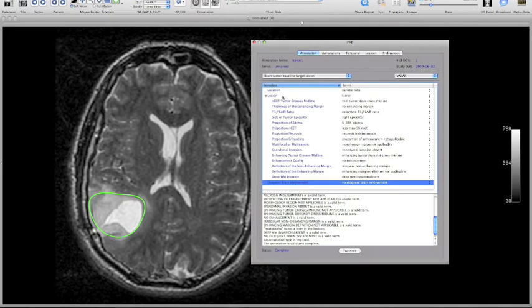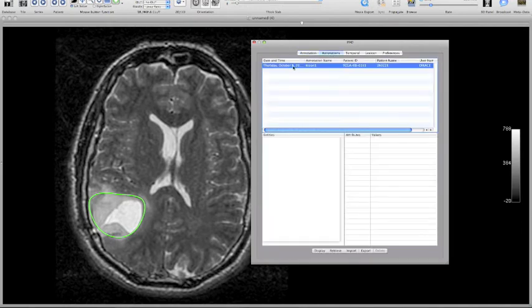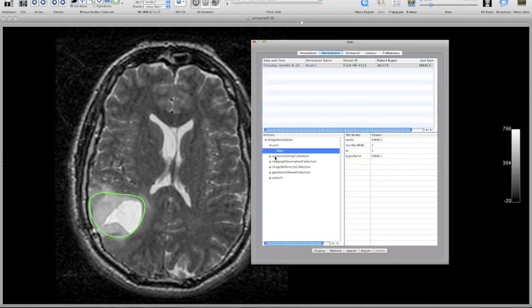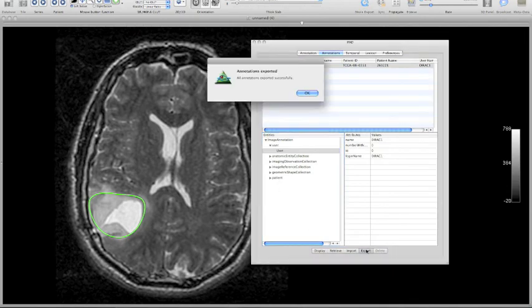Similarly, I can export the annotation. If I go to the annotations page here, I can click on that annotation, and if I wanted to, I could drill down into the various tables to show who did the annotation, the anatomic entities, and all the subterms here. But if I just click on export, then it should also export the annotation to a local database.